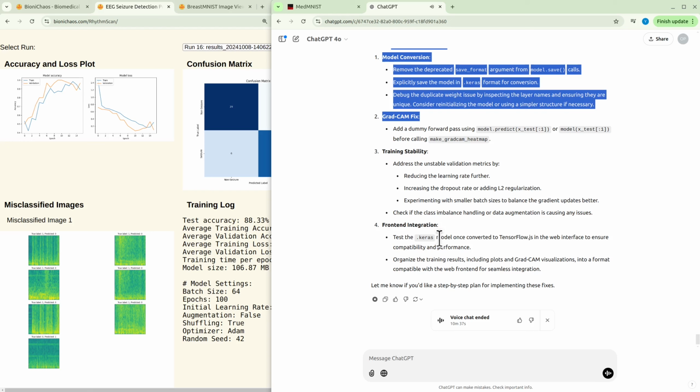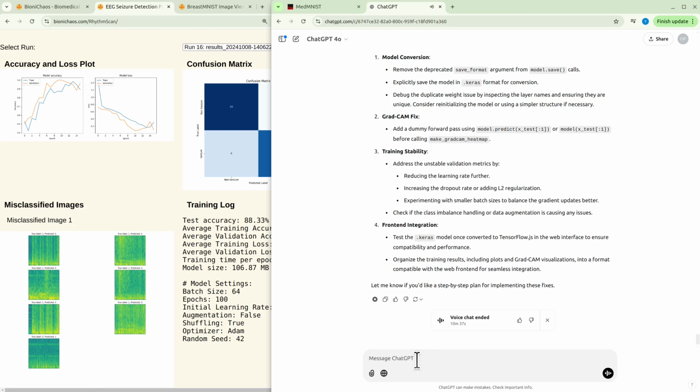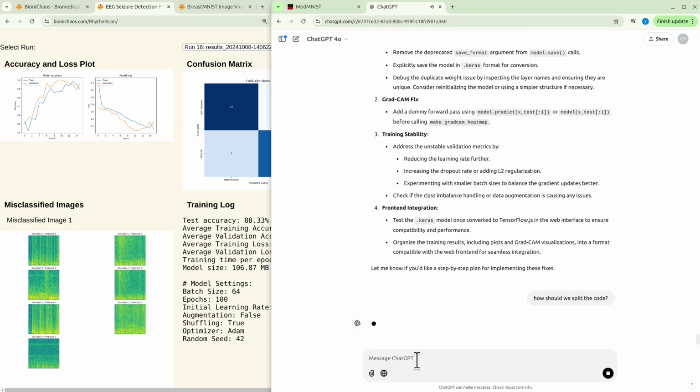The training script has run into several issues during execution, which need to be addressed sequentially. 1. Training results. The training process completed with a test accuracy of 76% and a test AUC of 0.81, which is moderate but below the desired performance. The training loss consistently decreased, but the validation metrics, accuracy and loss, fluctuated, indicating potential overfitting or instability in the training process.